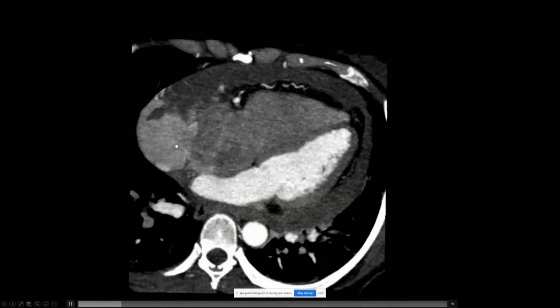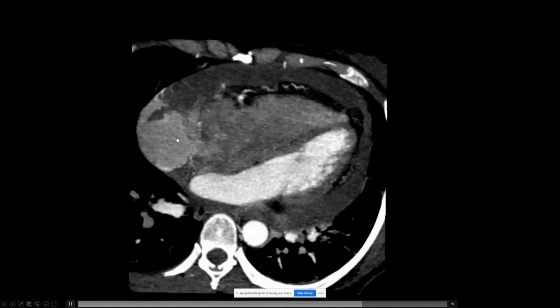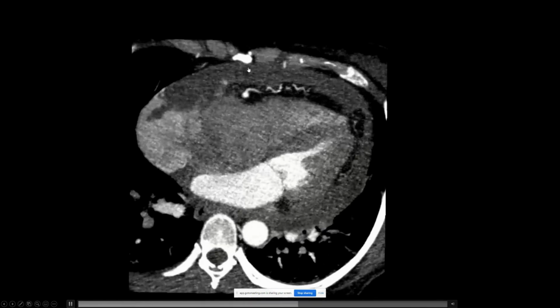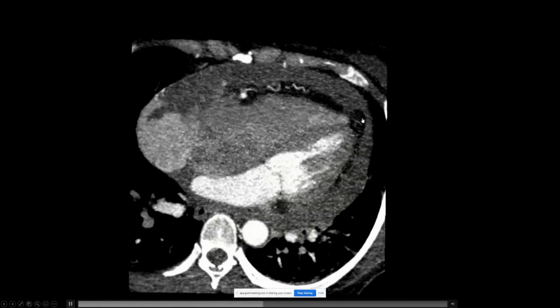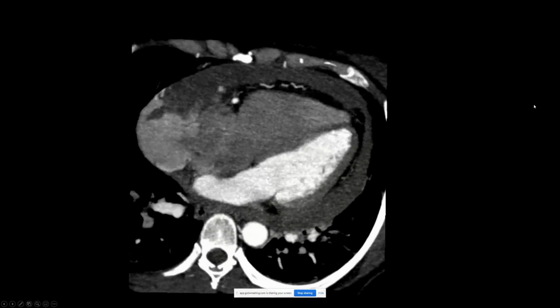And in this case, what they think is that the recurrent effusions have nothing to do with it, that they're just from her rheumatoid arthritis. You see, she's also got a pleural effusion over here. And it was just an incidental finding unrelated to her clinical presentation at all.